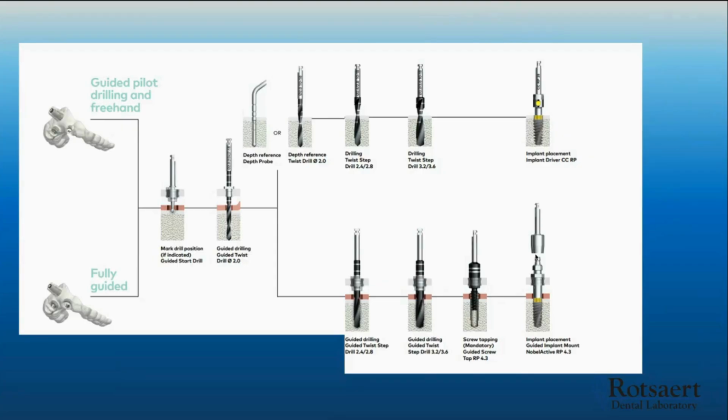And then as you put the implant into place, it bottoms out on the template. So it actually shows you where your planned depth is. And once that's all placed, you then remove that implant mount and either place a healing abutment, if that's the approach you're taking, or look at doing some sort of provisional if that was the treatment plan.